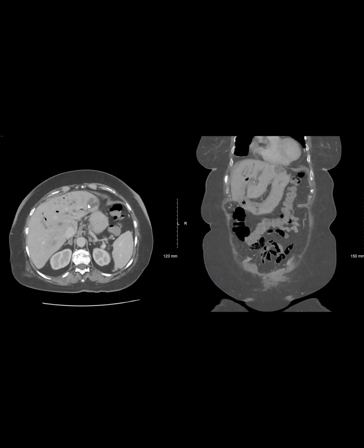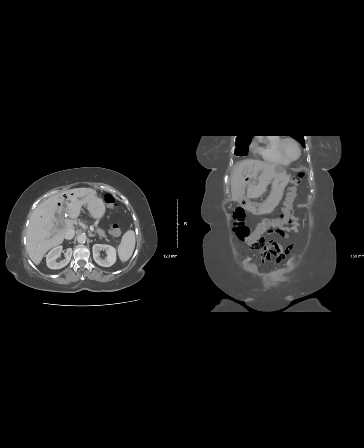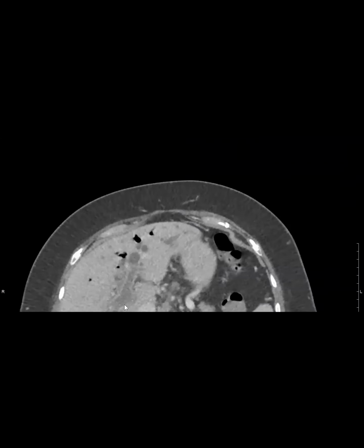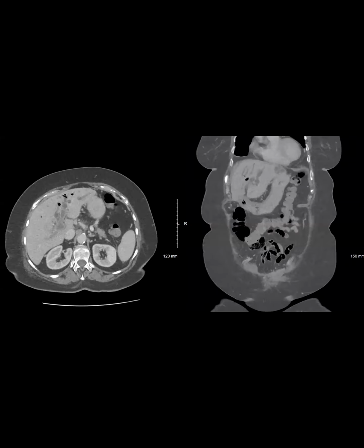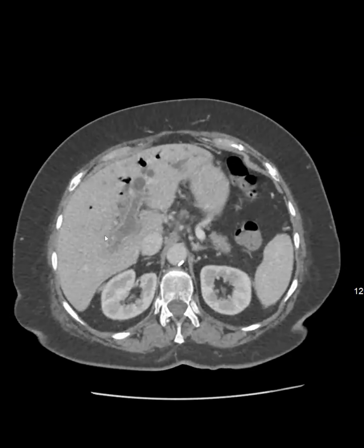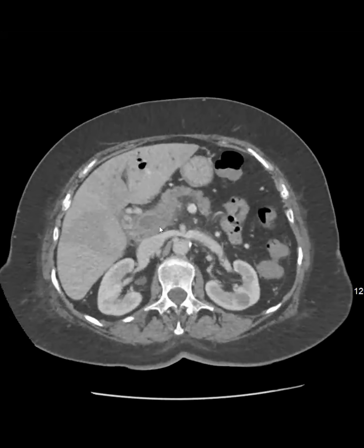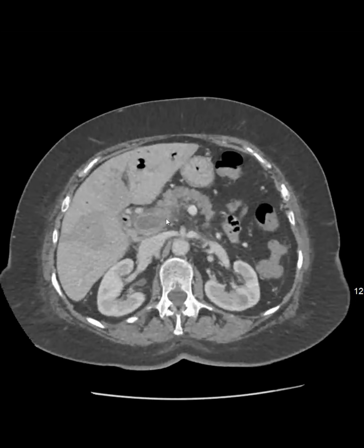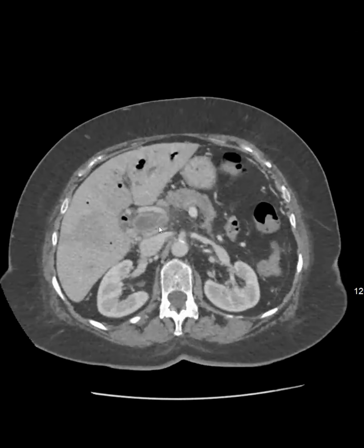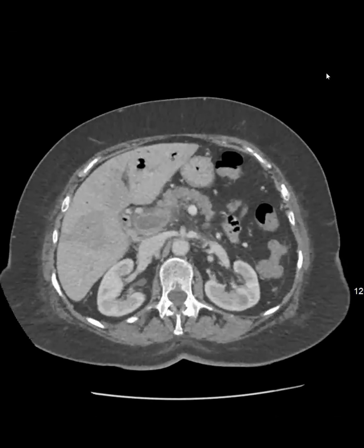Anyway, you can see the patient has cholangitis, the patient has an abscess, and this is a complication of cholangitis and abscesses, and this is thrombophlebitis. You can see that the portal vein is not only thrombosed. Is this okay in terms of zoom? Yes, that's good. You can see that there's also wall thickening right here, and heterogeneity, so this is not just acute thrombosis, but because you see the hyperemia and thickening of the wall, this is actually thrombophlebitis.